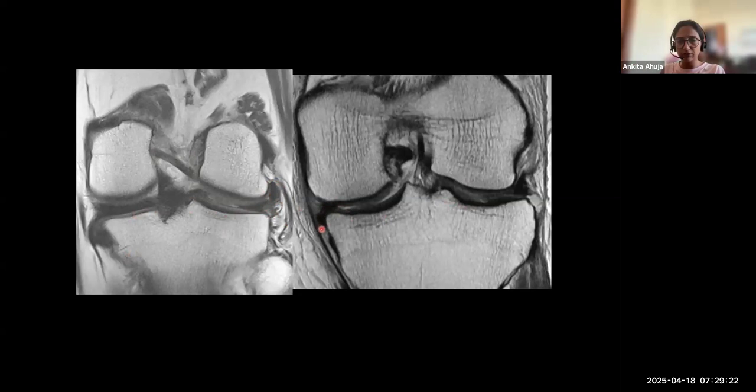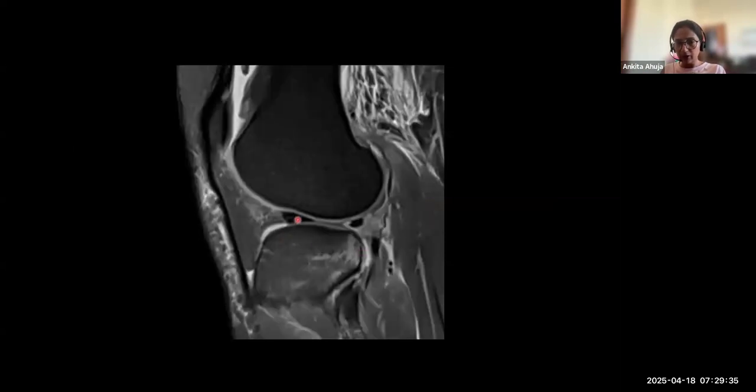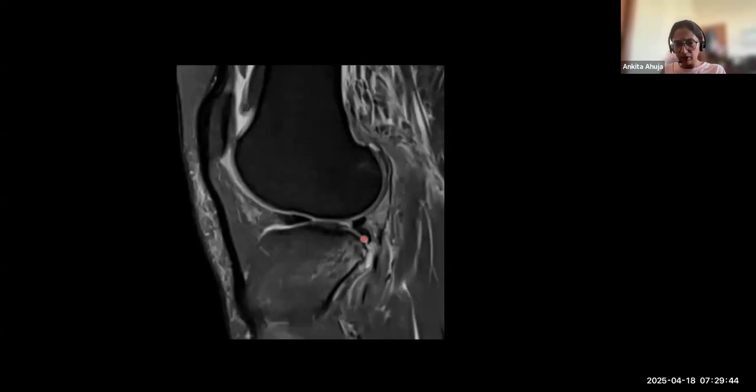That's why I was showing you the size of the medial meniscus. So this is nothing but your flap tears, which most commonly go to the gutters, but they can go anywhere else. So let's see what anywhere else means. Body lateral meniscus. Now do you remember the body of anterior and posterior horn should be same in size. Posterior horn is pretty small. Isn't that weird? So let's find out.